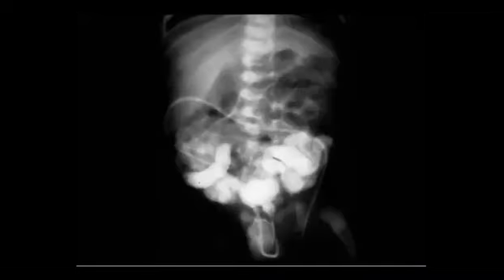This infant has big flanks, bulging flanks. So what does it mean if you have these bulging flanks? That maybe there is distension of the abdomen, and if I show you this one, bilateral vesico-ureteric reflux, more dilatation of the lower ureters, again distension of the abdomen.